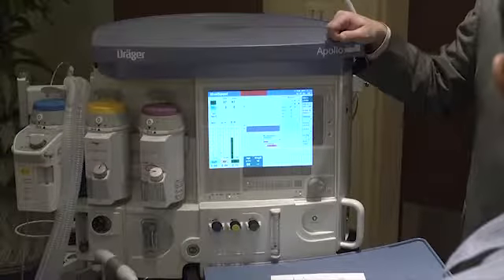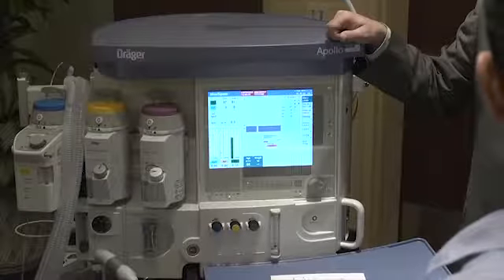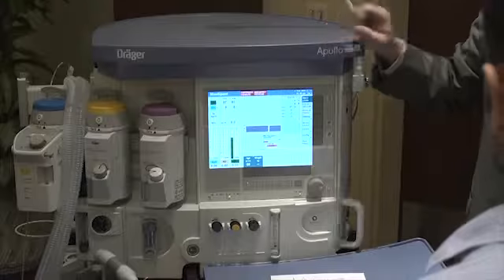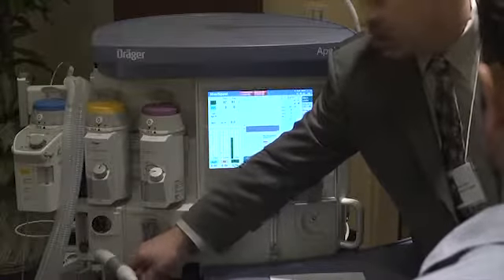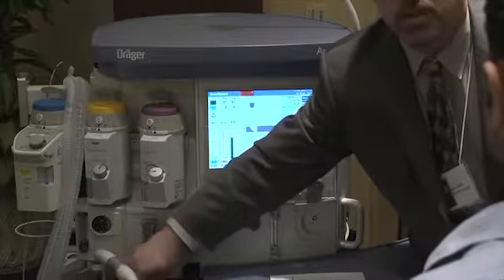That's one situation you want to keep in mind when you use the oxygen flush valve. When the APL is closed or during the respiratory phase, you will end up generating a lot of pressure in the lung by pushing high flow. So this valve, you could open it or you can just lift on it to dump pressure, either way.